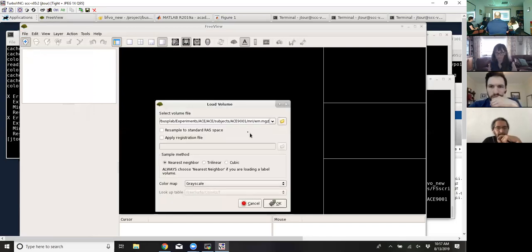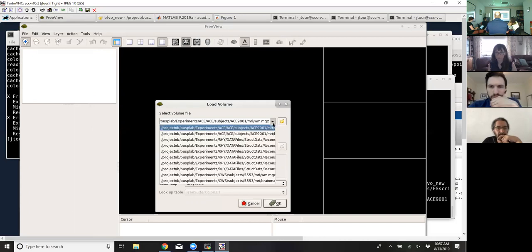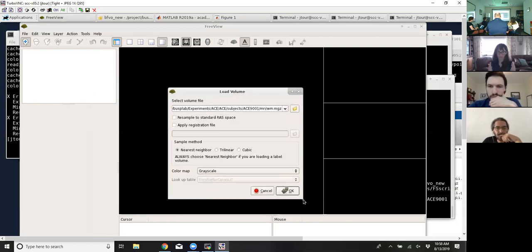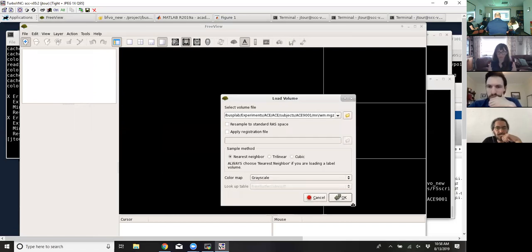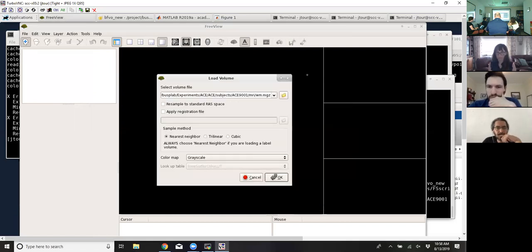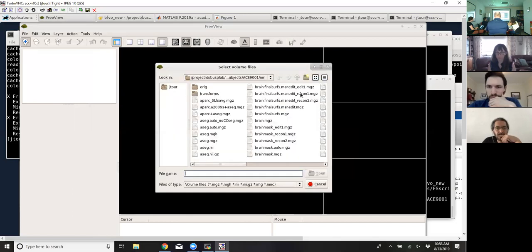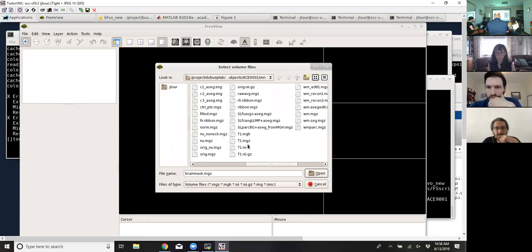And I was just in here, so let's say what I want to do, I want to look at, say, well, I could look at the original T1, right?